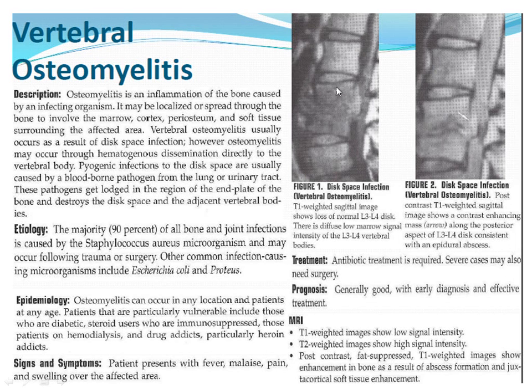So if you ever see something that looks so irregular and so heterogeneous, a lot of bone marrow edema in the vertebral body, which would be low on T1 and bright on T2, you see that around a disc, you should think about giving contrast if you can. This is something that usually doesn't require surgery unless they have an epidural abscess that is large enough to cause compression of the cord or the nerve roots. So sometimes they'll have to do it to drain an epidural abscess.